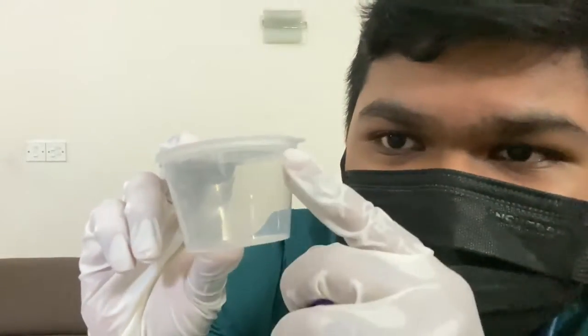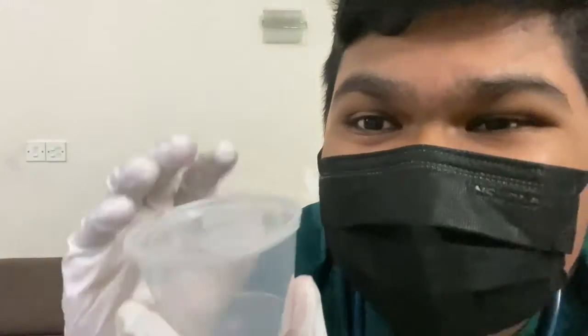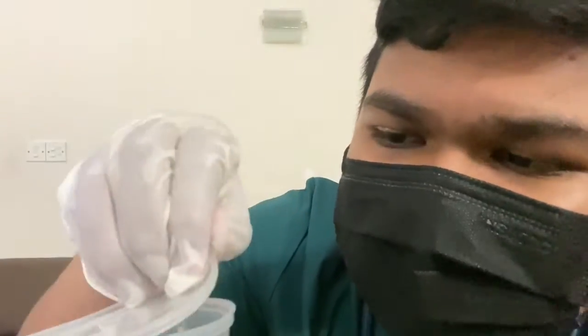Usually in Malaysia, we would write our own specific identification card number given by the government. However, during the demonstration, I will be using this container just because of the volume. There is more volume to show a more exact representation for the volume of urine output that we should be collecting. But it opens up like this.